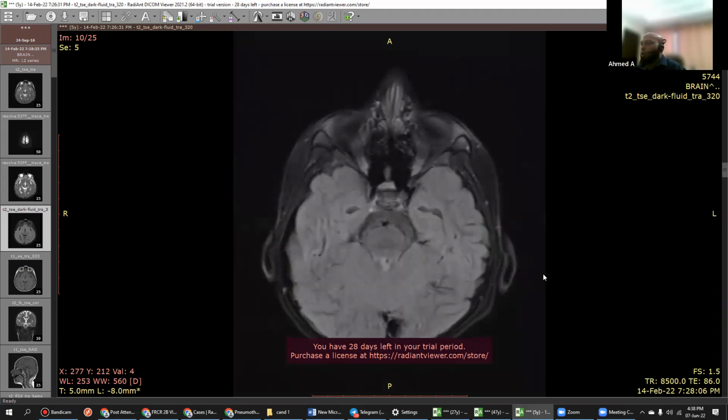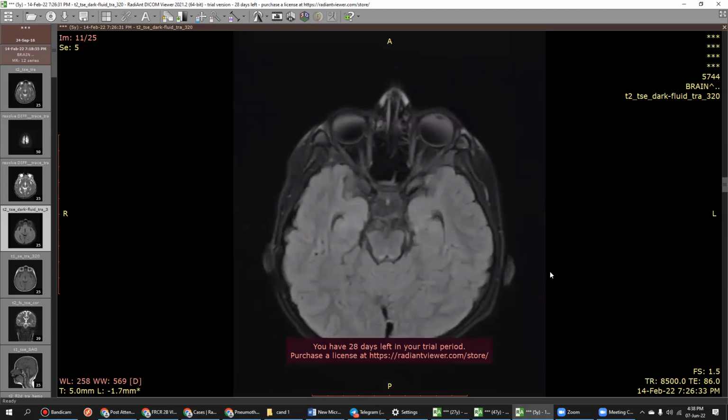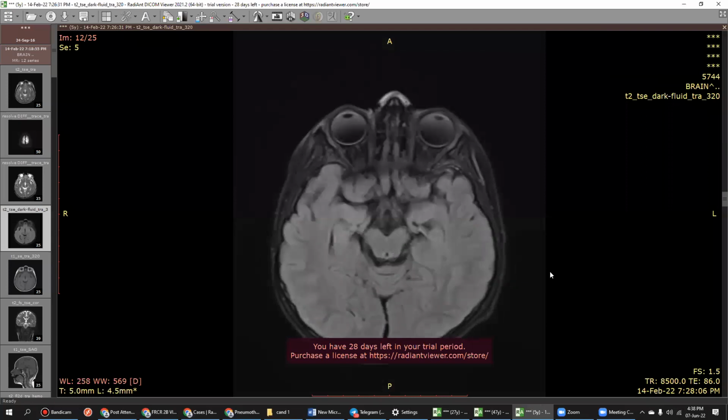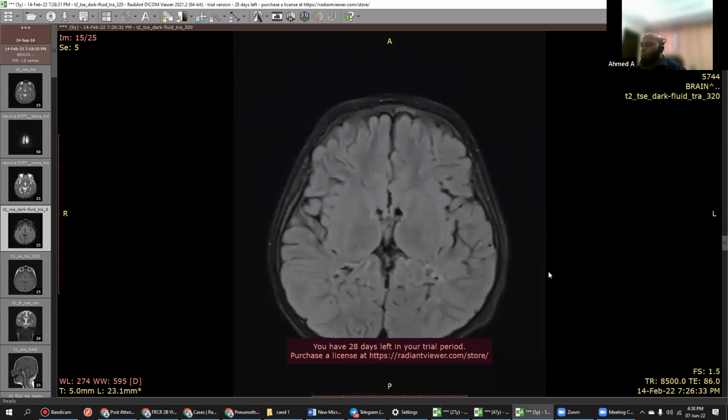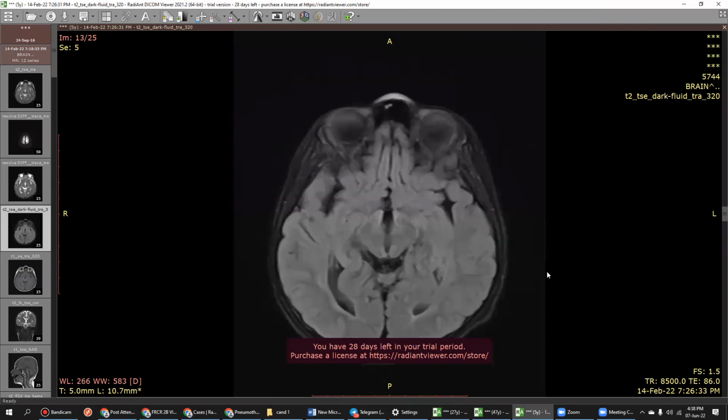So what are your review areas? So my review areas for the brain are, I will start from the calvarium. I don't see any evidence of any... No, only the brain parenchyma. In the brain parenchyma, my review areas basically are any intracranial mass, any hemorrhage. Okay, anyways, I'll help you in this case.